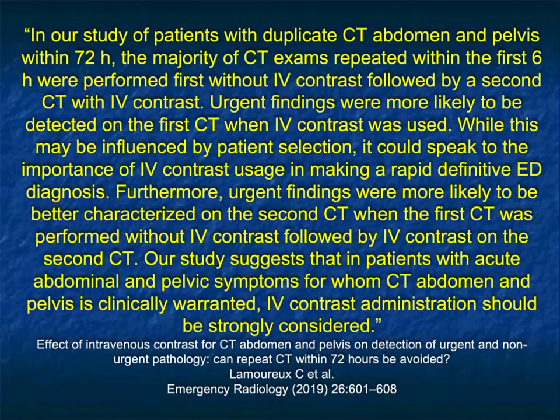If you don't give IV contrast, if you're just doing everything as a non-contrast, if there's a big mass present, you'll find it. But think of the kidney for a second. We'll talk about the kidney a bit later, but if you don't give IV contrast, you're going to miss infarcts, you're going to miss pyelonephritis, and you're going to miss small tumors. Okay, yes, you'll pick up stones on a non-contrast, but that's it. There's so much you're going to miss.